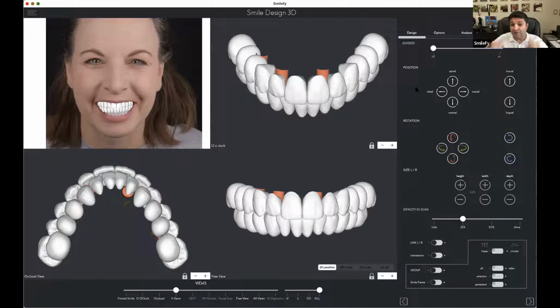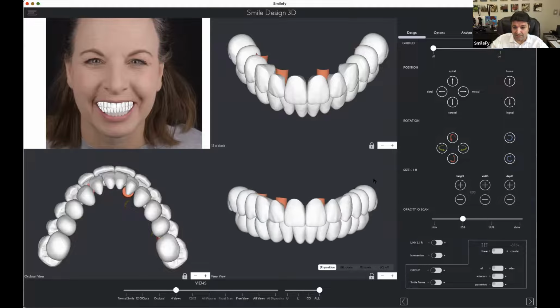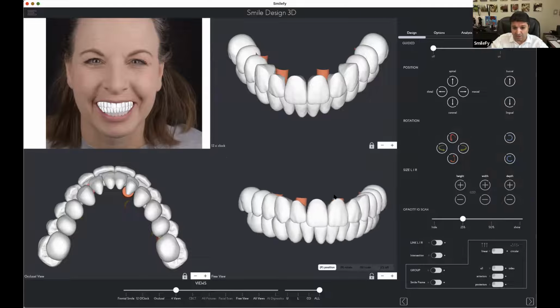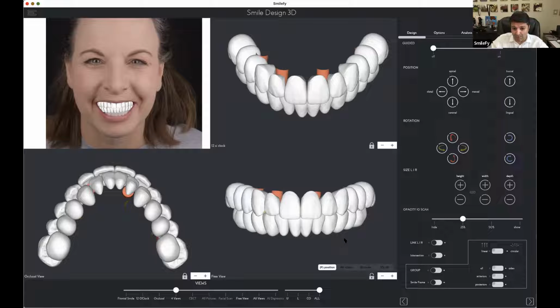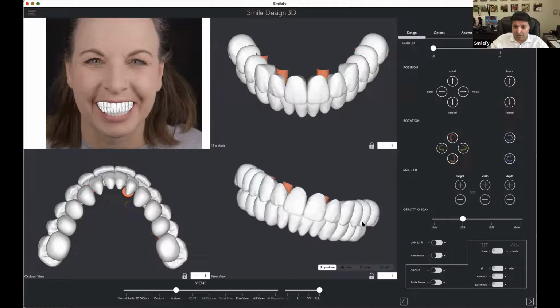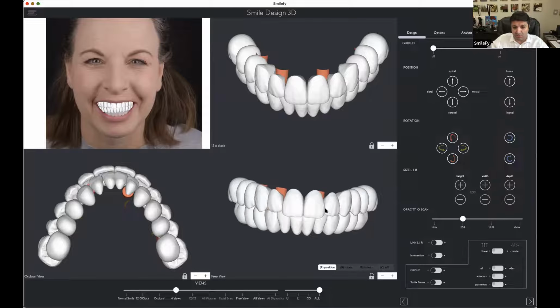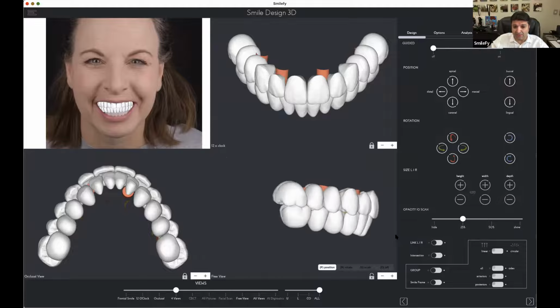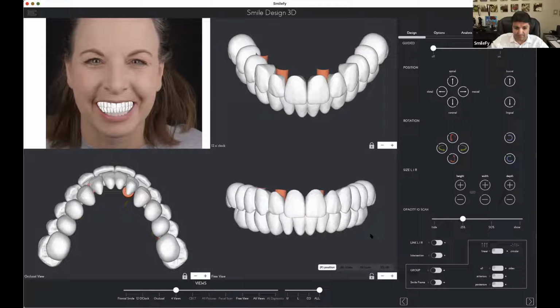So what do we have here? And it's very important. When we generate the upper lower design like this, you can lock here the position. So here you cannot do anything, here you cannot do anything, but here you still can move the design. Command R, you move now counterclockwise, clockwise, counterclockwise. And Command S, you can just rotate like this to the side.